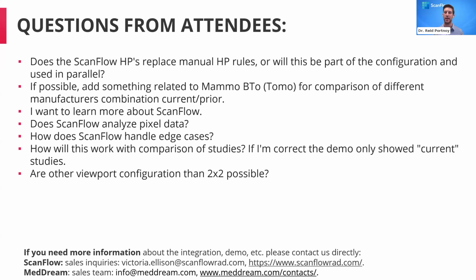That's the main crux of what ScanFlow deals with: different manufacturers create inconsistent labeling for the same sequence, and regarding priors and currents, ScanFlow can handle all of that on a per radiologist basis and per institution basis through our medical library.